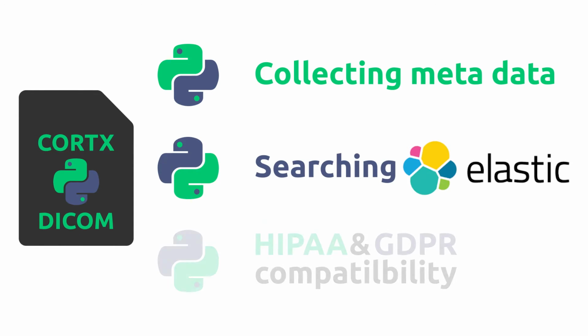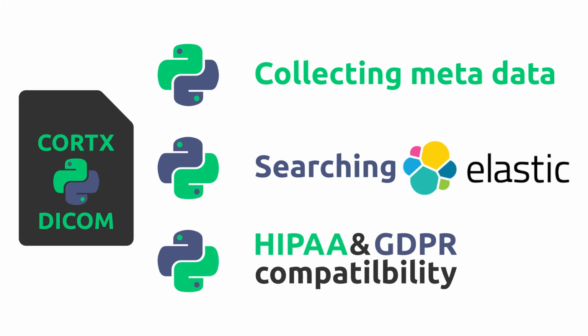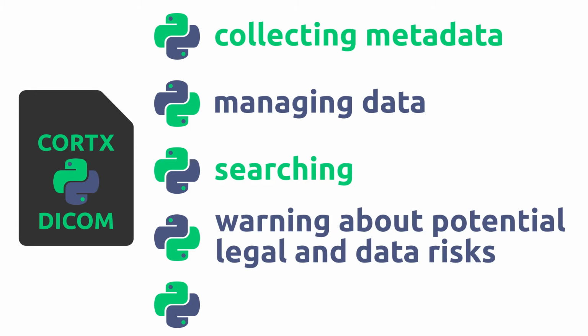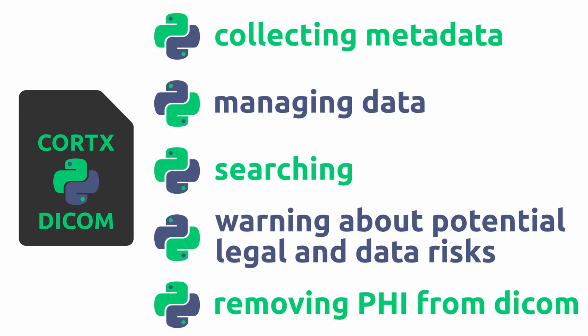We achieve this with a bonus feature like DICOM management in a legally proper way for HIPAA or GDPR compatibility, since we originally are lawyers. Our solution contains 5 major parts: collecting metadata, managing data, searching, warning about potential legal and data risks, removing protected health information from DICOM. Let's see an example.